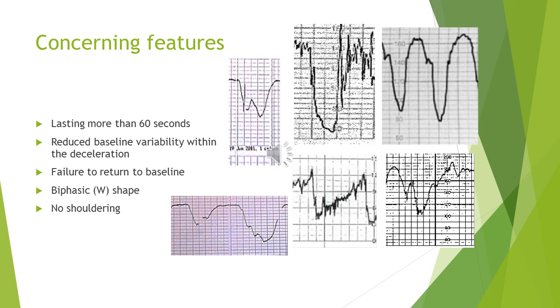Or biphasic. Biphasic means that, like in figure 1, the baby wants to recover, but he can't because there are not enough reserves, so he drops again. This means the baby is hypoxic and suffering.